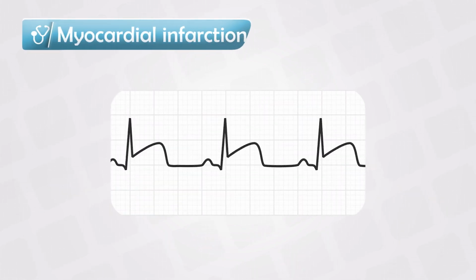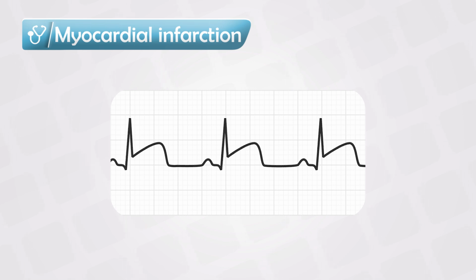The ST segment is absolutely essential. If it was either elevated or depressed, it can indicate a myocardial ischemia or myocardial infarction. In fact, we classify the cardiac infarction into STEMI and non-STEMI, which stands for ST elevation myocardial infarction and non-ST elevation myocardial infarction. So it is a very important interval.